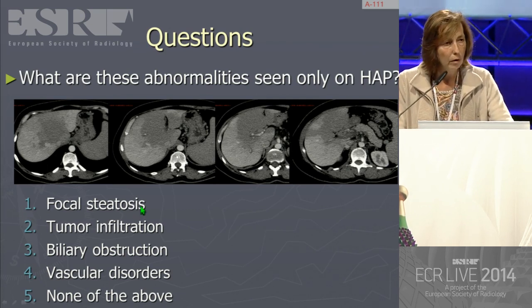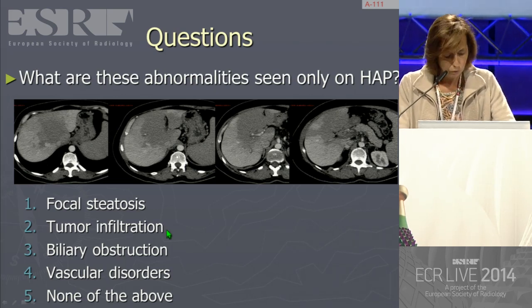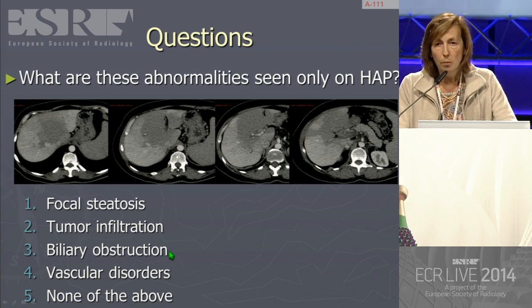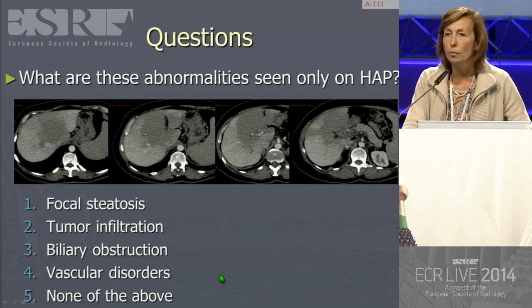Are we dealing with a focal steatosis? Does it correspond to tumor infiltration? Answer B. Could it be a biliary obstruction, vascular disorders, or none of the above?